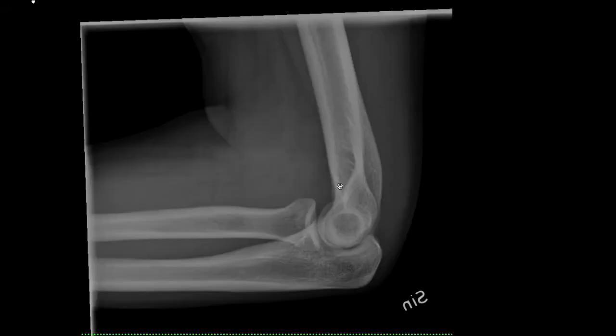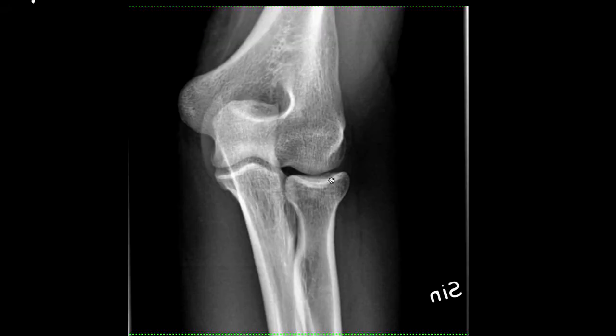You can't see it here. And here, you can just see it because I showed you the other ones, but really you can't see anything here. So I want to show you more. Let's get to it.